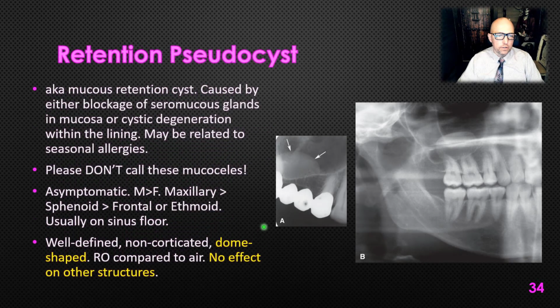All right, retention pseudocyst. Why do I say this here? Don't call these mucoceles. A lot of dentists will call these mucoceles. We want to stay consistent with ENTs. You know, they're kind of the specialist of the sinuses. Mucocele to an MD or an ENT is going to be very different. That's when the sinus gets completely filled with fluid. That's more of a sequela of sinusitis.